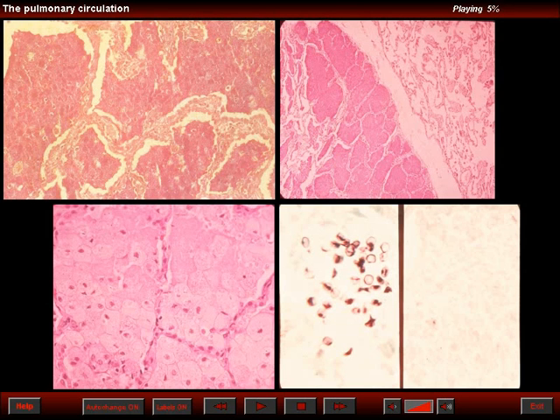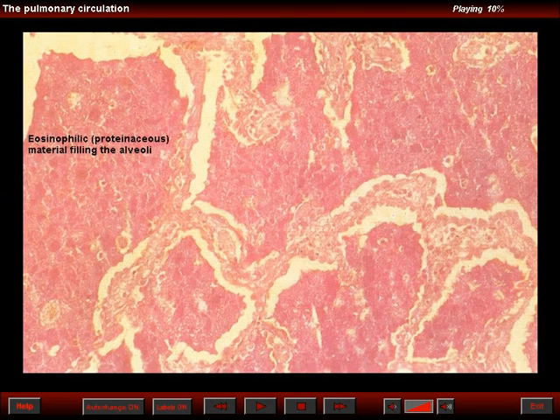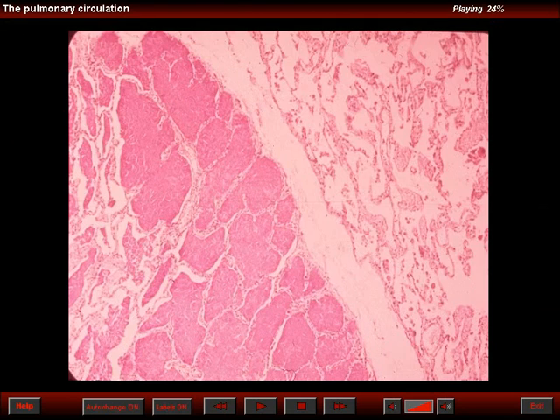These are histological sections of a patient with pulmonary alveolar proteinosis. On H&E stain, the material is pinkish. It also is of a red color on the PAS stain. Note the integrity of the interstitium. Also note in the top right that alveolar proteinosis affects one area of the lung, and other areas may be absolutely normal.